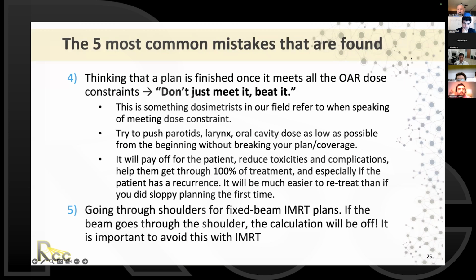No, just going to say the simple ones like labeling, patient identification, dose, site being treated. You just want to make sure that when you're doing your contour review and plan review, everything does match up with the clinical history really well. Sometimes when you're reviewing the contours, they may look okay, but do they match this patient's clinical history? Like what levels were dissected? Are you covering those levels?